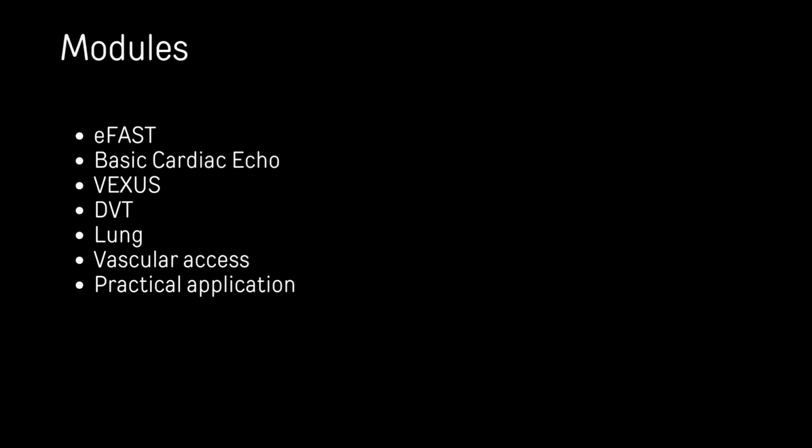So we're going to go through EFAST and basic cardiac echo. We're going to talk about VEXUS. I don't know if any of you have come across VEXUS. Quickly DVT, lung, vascular access, and then some practical applications.